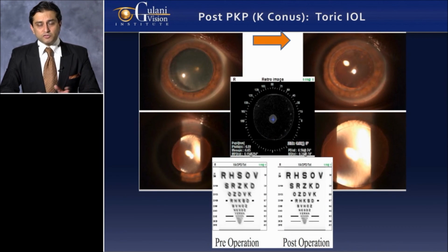For example, this patient was flown to me following a PKP done a long time ago on this patient, beautifully done. The patient had cataract, high myopia, high astigmatism. Now, when I looked at this patient with the OPD, I could see the cornea had some impact on vision, meaning the cornea element has to be addressed. At the same time, the cataract was a major player in decreasing this patient's vision. Now, associated with the cataract, that's how I like to think all the time, this patient also had refractive errors, high myopia, astigmatism, presbyopia. So we take this patient in his non-dominant eye and perform a toric lens surgery.